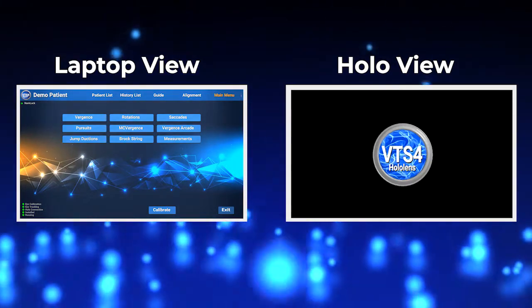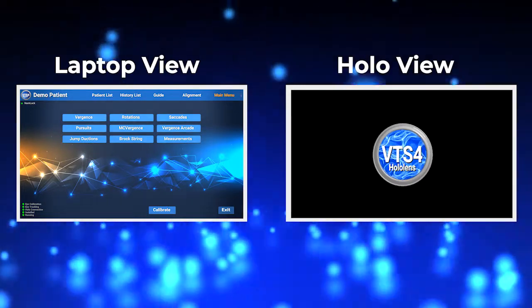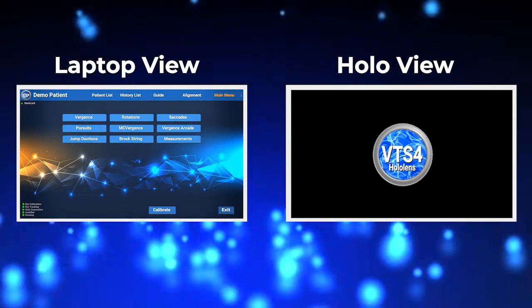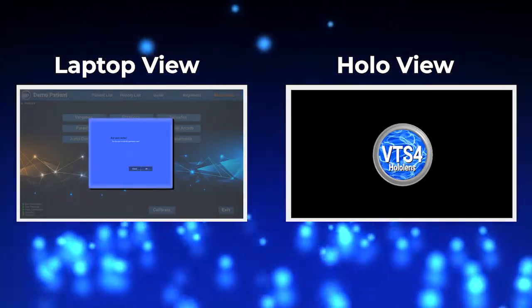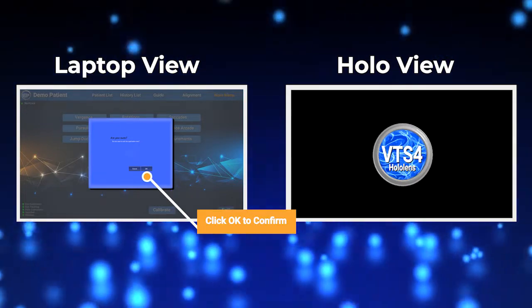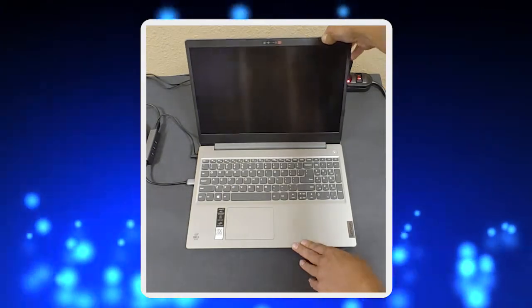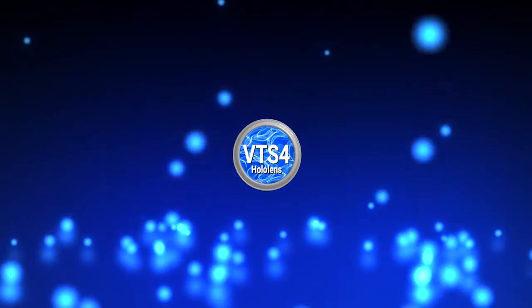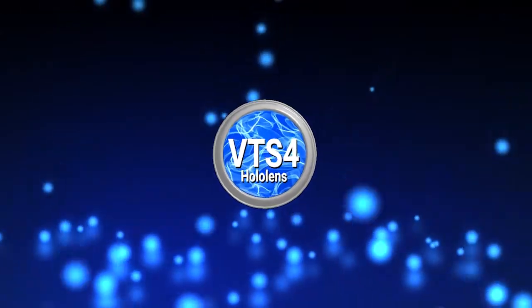When you are finished using the VTS4 for the remainder of the day, return to the main menu by clicking on the main menu button in the upper right, set the HoloLens down and connect it to power for charging, click the exit button, which will send a power off command to the HoloLens. When ready, click OK to exit. Then lastly, close the laptop lid to put the laptop to sleep. When you return to the VTS4 after this shutdown process, perform the steps in this video from the beginning to get the VTS4 ready for use.